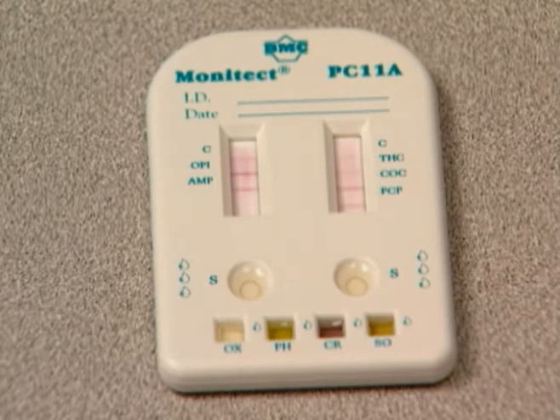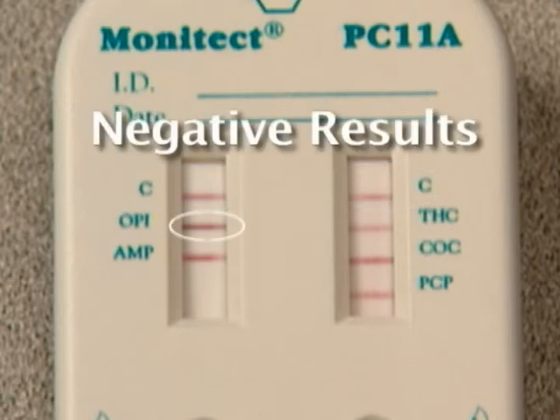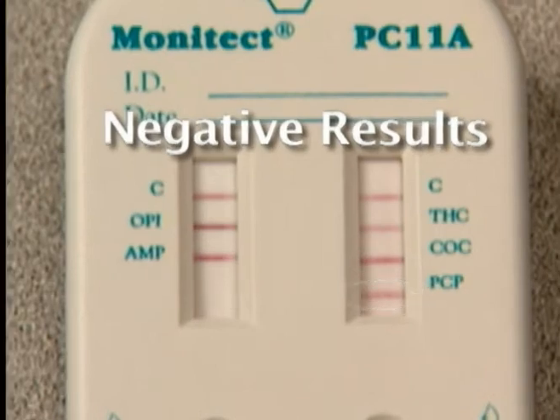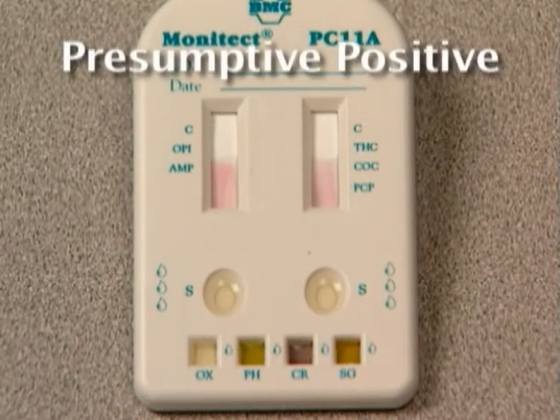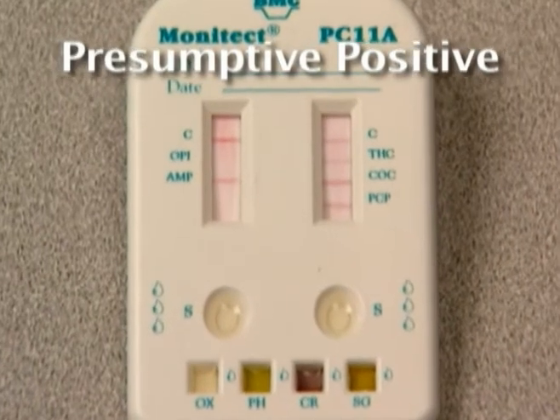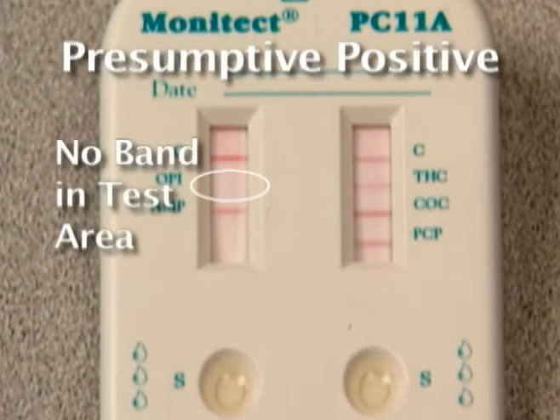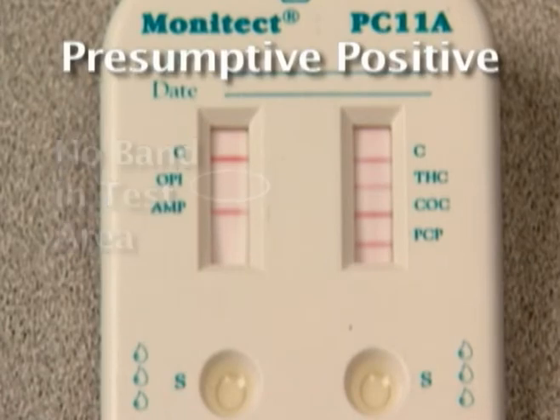Negative results are ready to interpret once the control bands C form. Any colored band that can be seen visually, no matter how faint, is a negative result. Presumptive positive results can be interpreted once the control bands C form and the membrane background clears in 5 minutes or less. A presumptive positive result will show no band in the specific test area. Results are stable and may be interpreted for up to 15 minutes after the control bands C form.